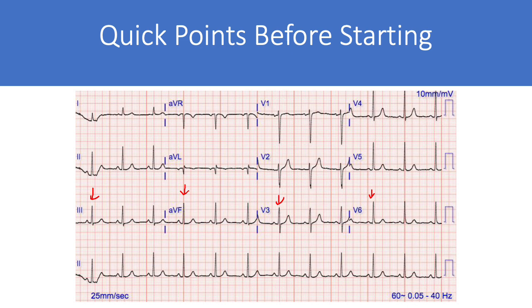So what we're seeing in a 12-lead ECG is that we are seeing 10 seconds in time. You can see the top 3 lines of tracing are the 12 leads that we've discussed before, labeled, as we had mentioned before, 1, 2, 3, aVR, aVL, aVF, V1 through V6 in the 4 columns. But they are all happening across the ECG, which is 10 seconds in time. So that bottom tracing that you see is lead 2 for the entire 10 seconds of the ECG tracing.